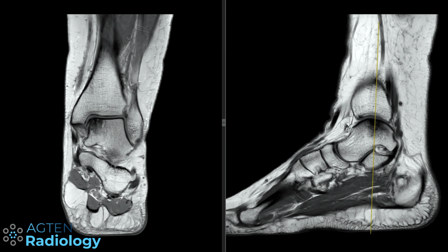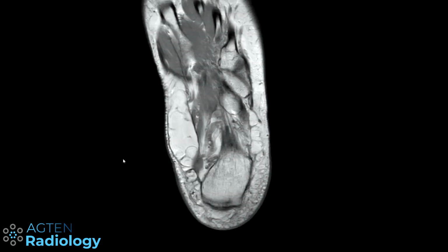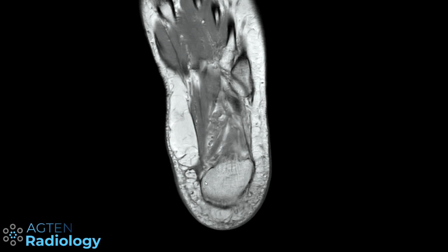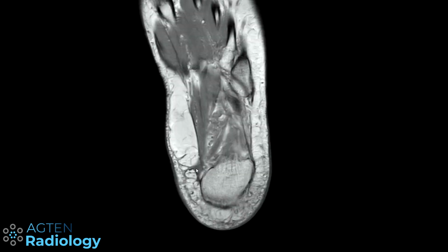But, and that's today's quick tip, this is just a normal finding. So this is not a lipoma, this is just normal subcutaneous soft tissue, and should not be mistaken for a tumor, and certainly not for something malignant, and you should not do a biopsy or whatever for this thing. And why is that? So you could argue, oh, but it looks like, yeah, but it doesn't.